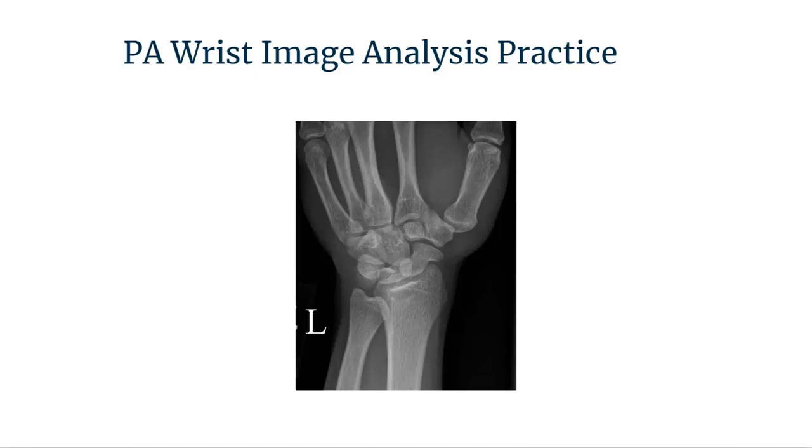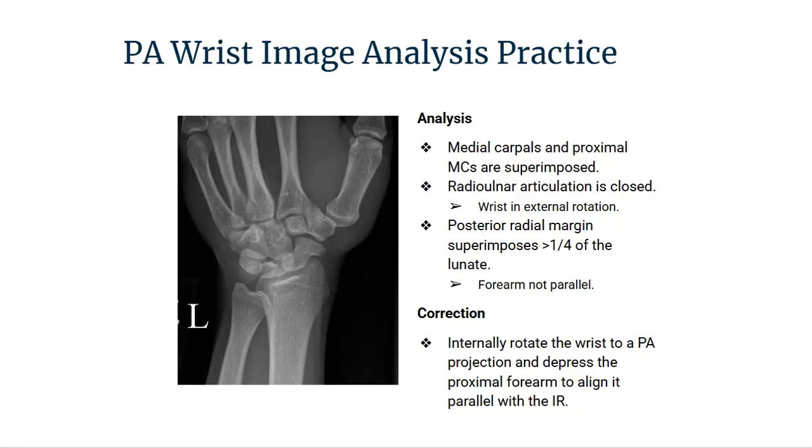Take your time and review this PA wrist practice analysis and answer the following question. So let's review this PA wrist analysis together. Again, you want to make sure that you have all your anatomic structures, with which we do.